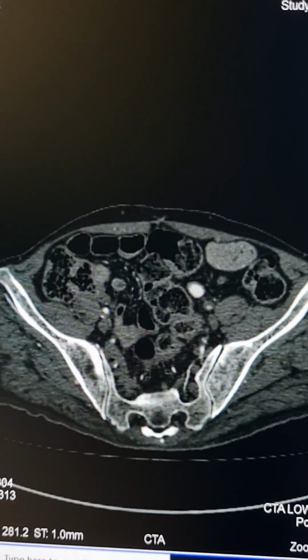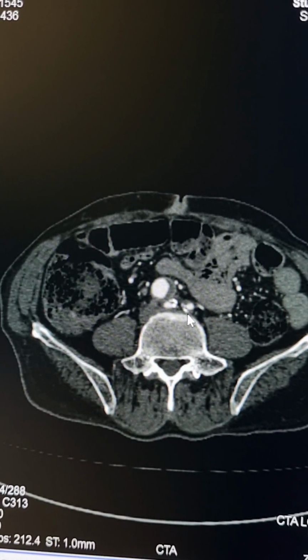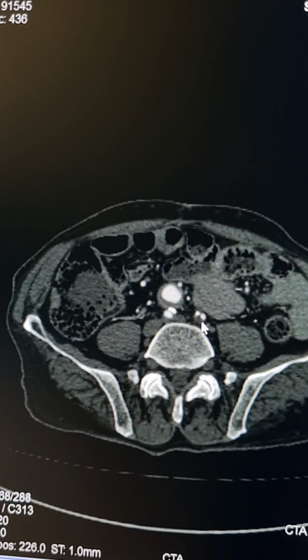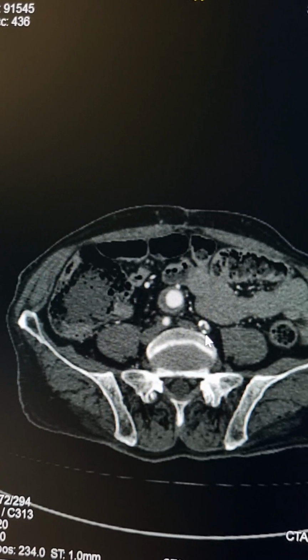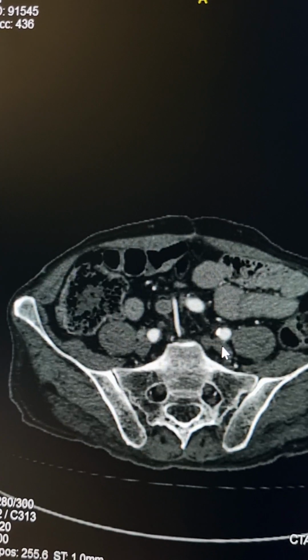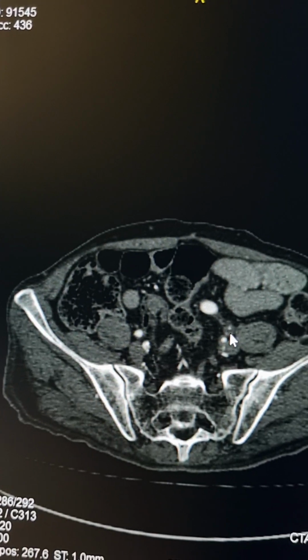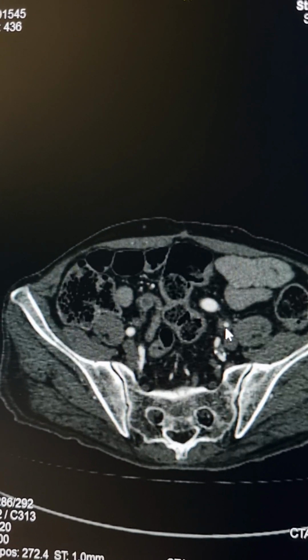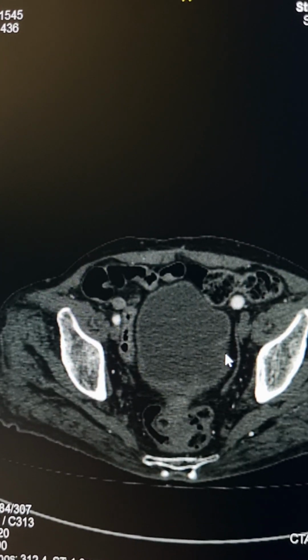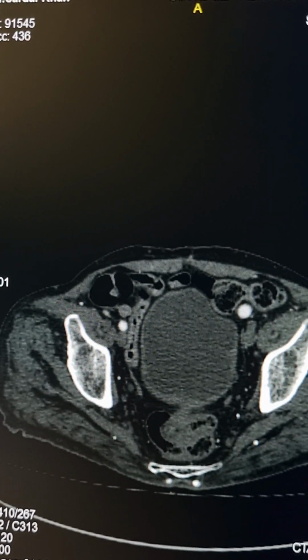Now I go back to the left common iliac artery. This is the left common iliac artery. You find this is the atheromatous plaque, calcified. This is the patent lumen. You see, so moderate to severe luminal narrowings. At places it comes again to life, and for example at this level it's hardly perceptible, just a very thin thread-like lumen left. Now this is completely thrombosed here. This is the left common iliac artery.